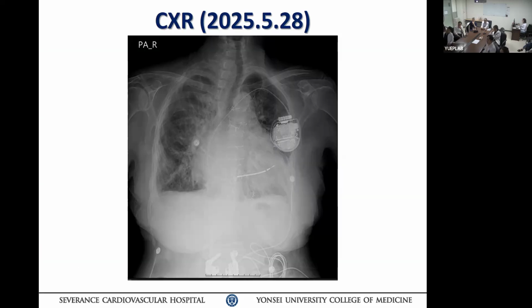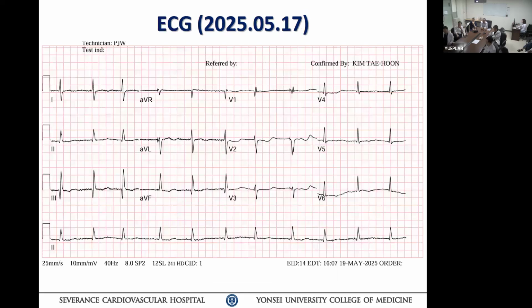Anybody have any other suggestion? Okay, this is AFib. So when she's not pacing much, it is now much better. But still, very much less. Then you probably don't need an ICD. We can consider the upgrade, but not at this point. It is not reimbursed, plus the risk is too high, and also there's no clear evidence it works for the patient. She has intermittent fusion here, some different degrees of fusion going on. This one compared to this has very minimal fusion. QRS is still narrow, so then you won't have much choice.